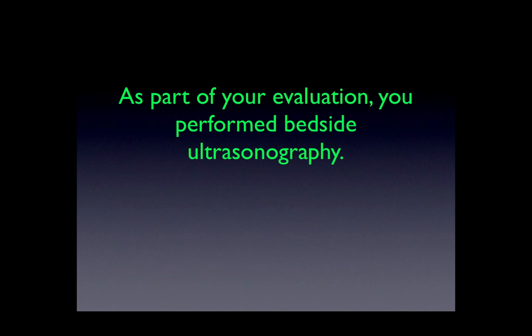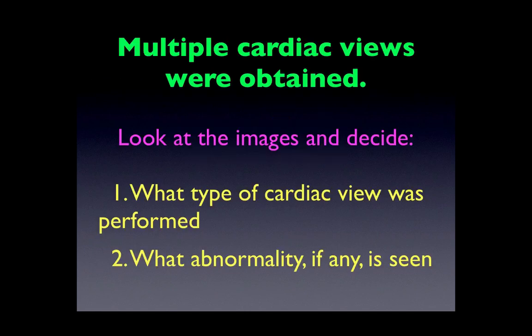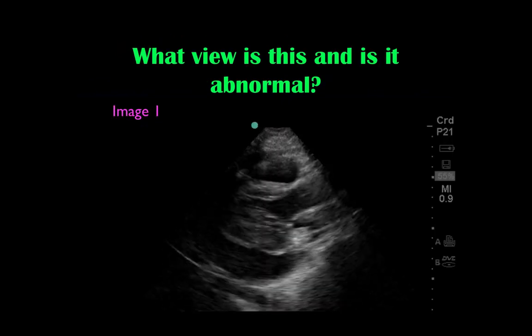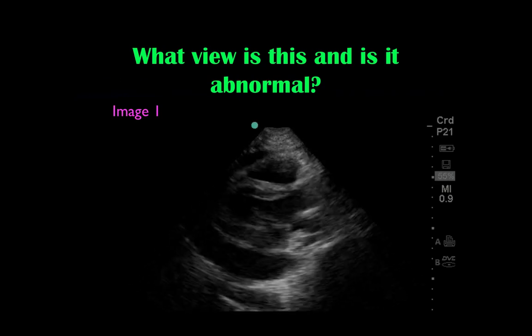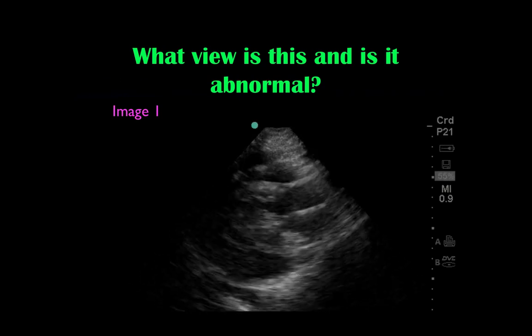As part of your evaluation, an ultrasonography exam is utilized. Multiple cardiac images were obtained in this case. So let's first look at these images and decide what type of cardiac view was performed and what abnormality, if any, was seen. This is image number 1. What view is this, and is there any abnormality?